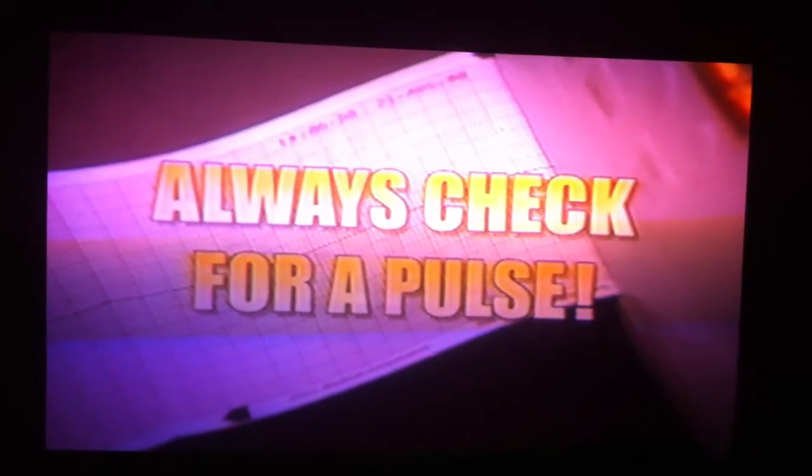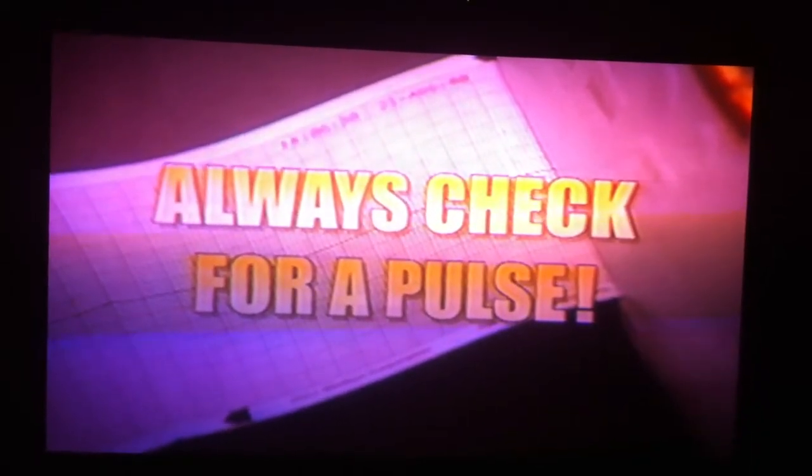A low voltage setting or an improperly connected lead can result in a straight line on the ECG monitor, showing a false asystole. True asystole is always accompanied by pulselessness. Always check for a pulse when you see asystole on the monitor.